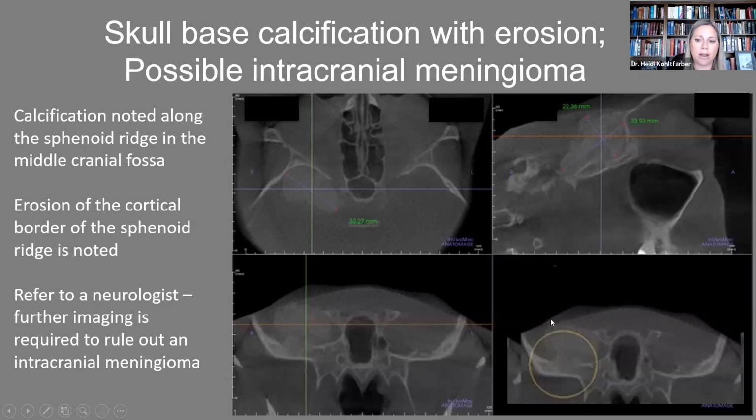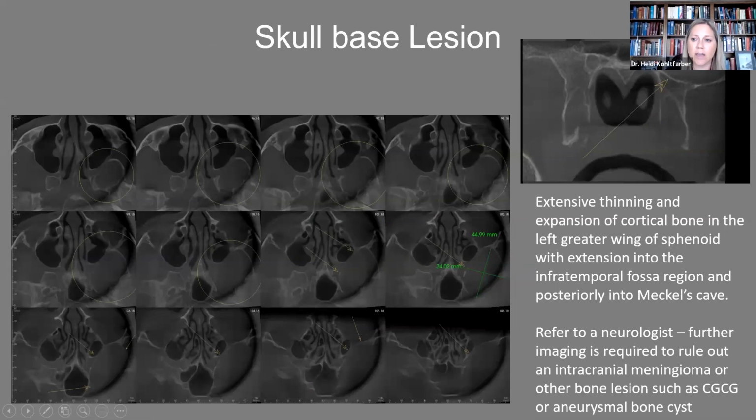And especially right now, with all the patients having gone through our COVID pandemic, they're afraid to go see their physicians. They're afraid to go to the hospital. You might be the first one picking it up with your imaging. This was another one that we just got.